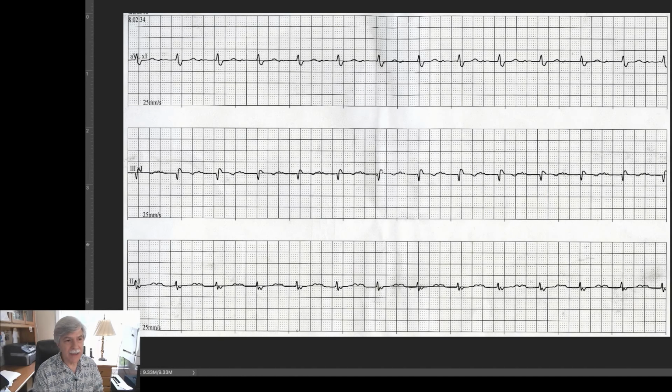And it's really kind of interesting because it's a lot faster now. Now here's a QRS that lands on a heavy line. So now it's above 75 beats per minute. It's probably about 80 beats per minute. But it's very regular, and if you look on top of the T wave, you see a very sharp bump here, and that looks like a P. Although the PR interval now is a lot longer than it was before. It's probably about 240 or 280 milliseconds. So what he's developed is a sinus rhythm at 80 beats per minute with a first-degree AV block. But his AV node is now back to conducting 1-to-1.